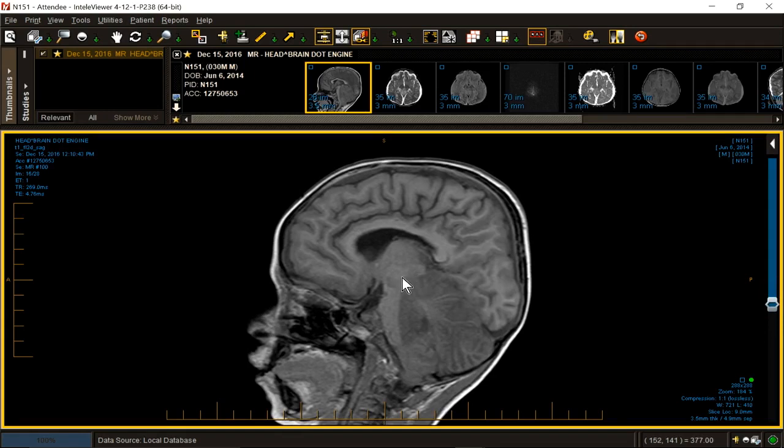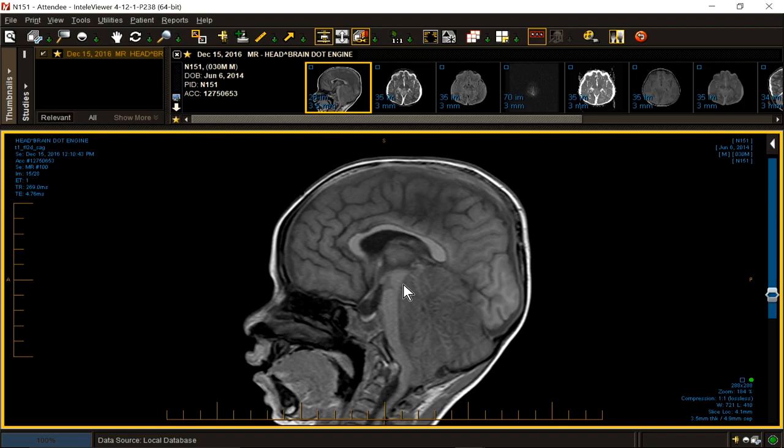Okay, the clinical history is a 30-month-old, under the age of 5, with altered mental status and seizure. As I usually do with pediatric cases, and with most MRI, but especially pediatric cases, because of the high incidence of anomalies, I begin with the sagittal T1.